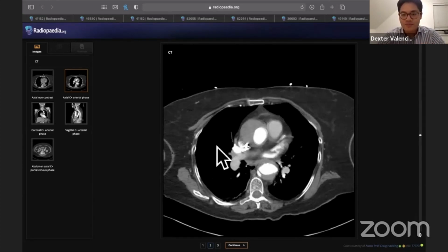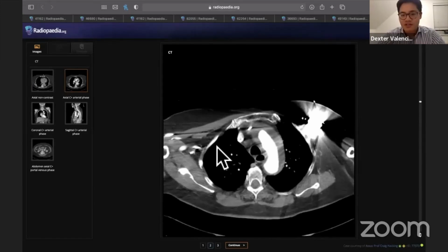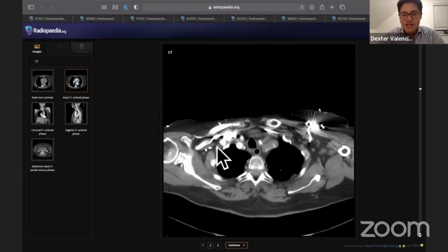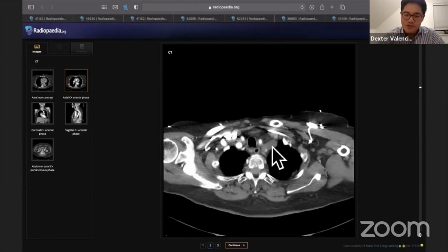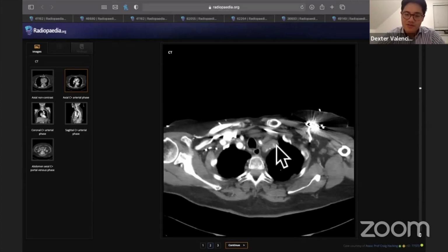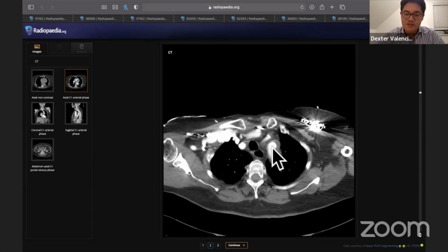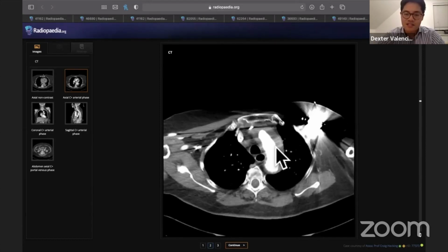And this is the lumen of the aorta. As we go up towards the arch, the patient hasn't got a pulse in the left arm, and similar to a PE, there's a filling defect. So this is the left subclavian artery, and as we can see, it just goes dark, and we can't see any contrast when you look at the other ones for reference. So this one has contrast. That's the left common carotid, and this doesn't have any. So that's occluded because of this intramural hematoma and dissection.